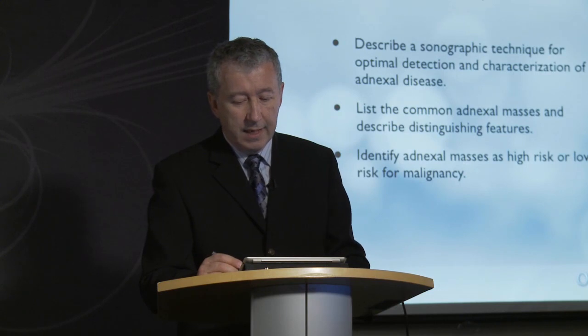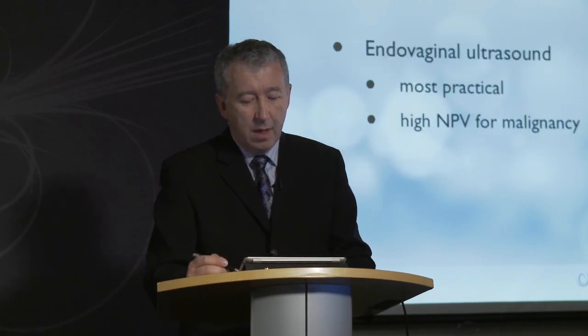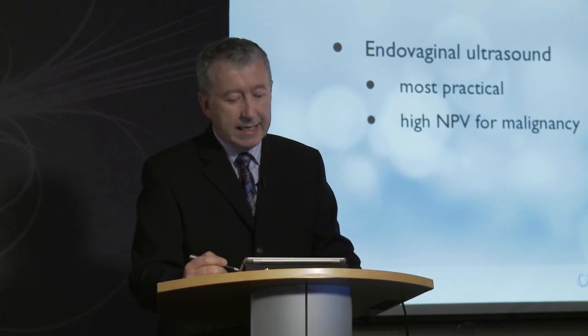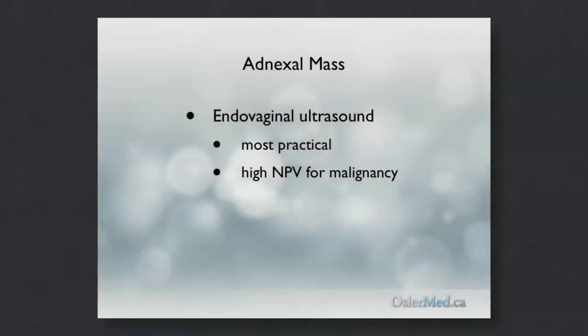Now, endovaginal ultrasound has a very high negative predictive value for malignancy when evaluating adnexal masses. So it has emerged as the most practical modality for the initial assessment of these patients.